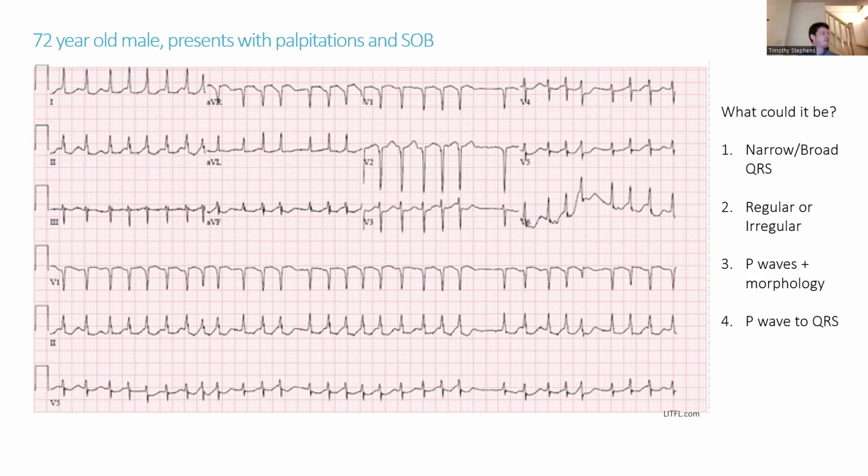Can anybody maybe put in the chat, just to make me feel a bit better that there are people out there, what this is?